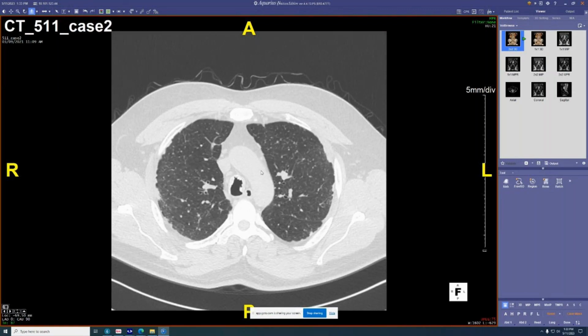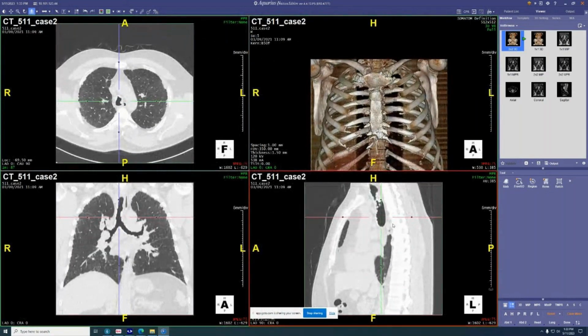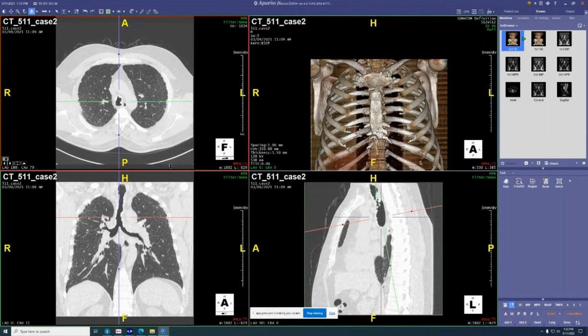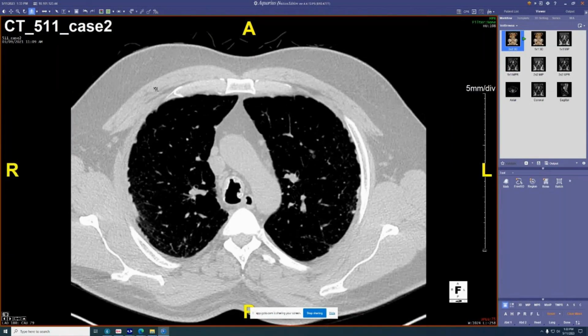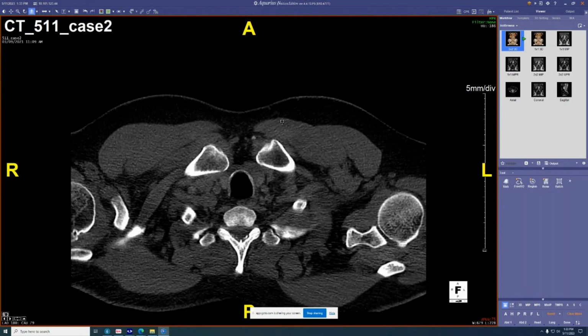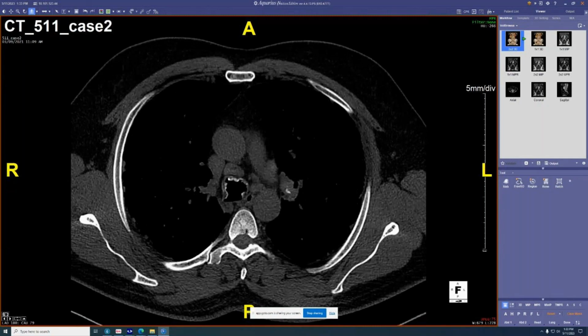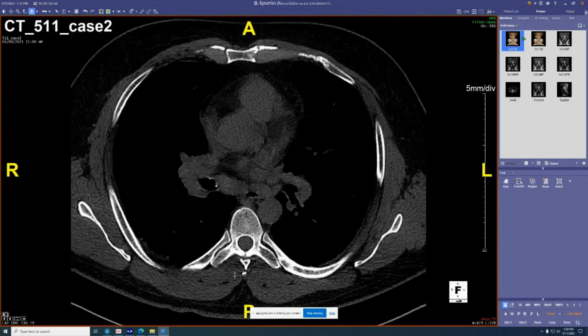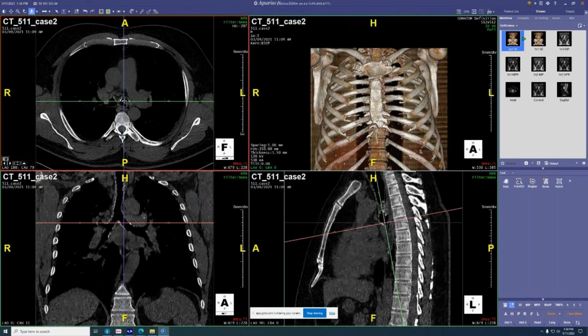But what's then going on with his airways? Yeah. So that's the kicker. So then on top of the silica, he has this profound, weird thickening and calcification of, you can see very beautifully how strikingly just involving the cartilaginous portion of the trachea. The membranous portion is very conspicuously spared and actually goes in to involve the main stem bronchi, quite thickened and irregular, but not really stenotic.